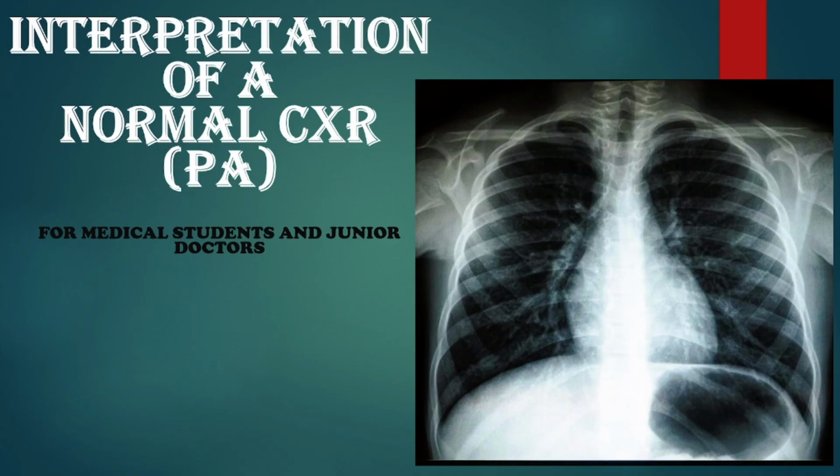In our first lesson, let's learn about one of the most frequently requested radiological investigations, that is chest X-ray. Before understanding pathology, we should appreciate the normal chest X-ray. Here we will mainly focus on posterior anterior projection.